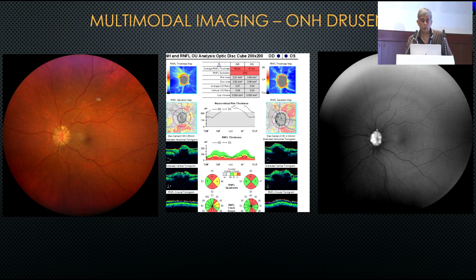Here, this is a patient who was originally diagnosed as a patient of papilledema. She had been to 2 other doctors. It was basically a blurred disc, and they had been carrying on with that, and the OCT showed no cupping as well as no elevation.